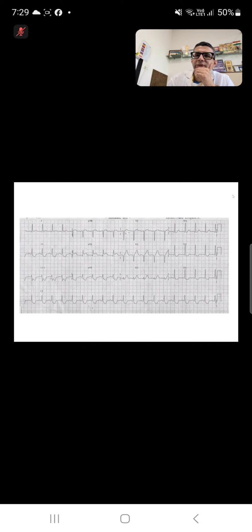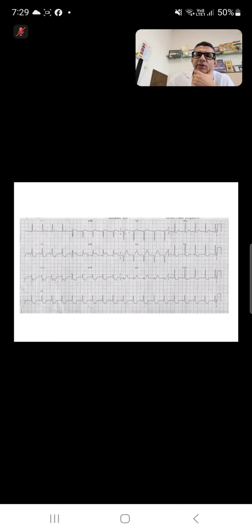Ashish, you want to answer that? Sir, can you repeat the question, sir? The question is, now this patient has anterior wall ST elevation, and then you have reciprocal ST depressions in the inferior leads, L2, L3, AVF. So I asked Prasad, what is the significance? One of the things he said is it's reciprocal changes. So the patient has anterior STEMI and has reciprocal changes. What other things might it indicate?